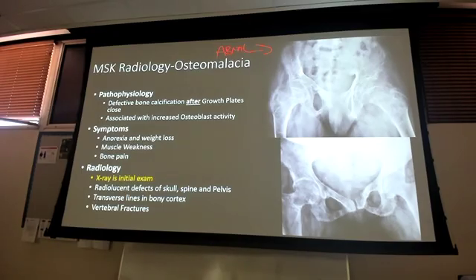Why am I having these darker, more radiolucent areas in a fairly dense bone, right? The pelvis is a pretty dense bone. There's not a whole lot of reasons for it to have darker radiolucent patches throughout it. For everybody over here, I was pointing out this area here, this area down in here, a little bit right in here. This patient is rotated a little bit, but those are your radiolucency areas. But it's hard to tell if that is osteomalacia just from that, right?